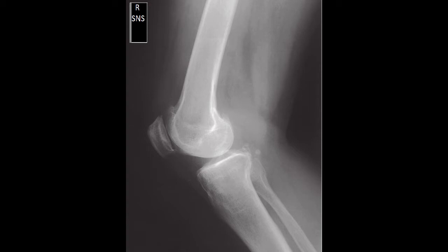You can see an open joint space between the femoral condyles and the tibia, which is also really important, and you can see the soft tissue and bony trabecular detail of the knee. So this image was properly exposed. You can see my marker was on there. And this concludes my evaluation of the medial lateral projection of the knee. I would say that this is an acceptable image, and I would send this one off.